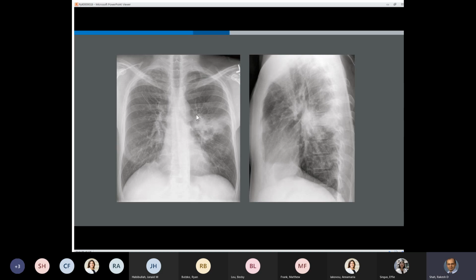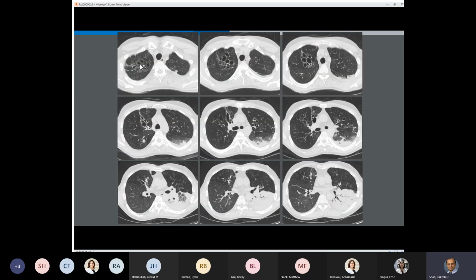A different patient, we can see that there is this lobulated opacity or consolidation in the left mid lung. In the right lung, we can see some tubular shaped lucencies. On CT, those things look like bronchiectasis. Intervening lungs look normal. So this is very patchy areas of bronchiectasis, and then they have some consolidation. If you see this picture where you have patchy areas, and if the history states that they have asthma, then this is a diagnosis of ABPA.